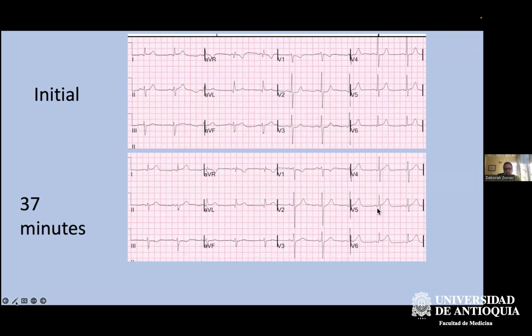What is a hyperacute T wave? It is fat. It is not tall. This is no taller than that. It's much fatter though. Longer QT interval, straighter ST segment, much more bulk to it than this one. A hyperacute T wave has to do with its bulk, its overall fatness, not its height.